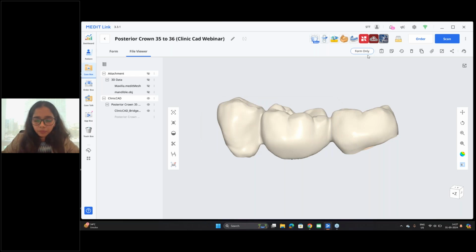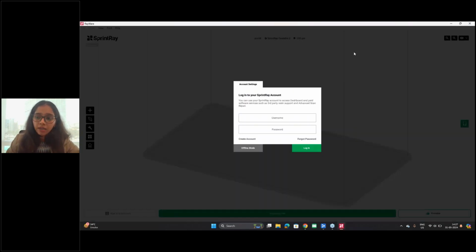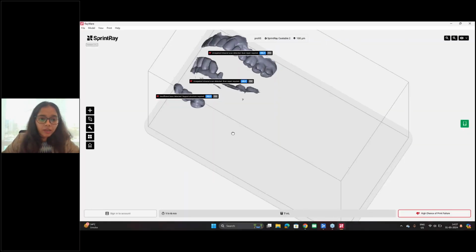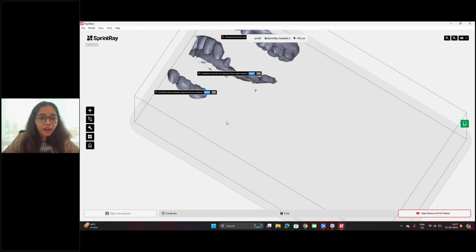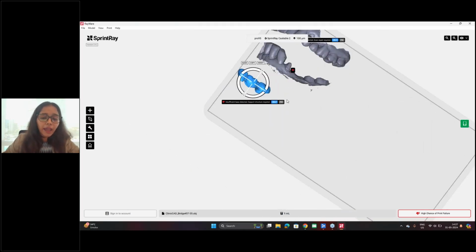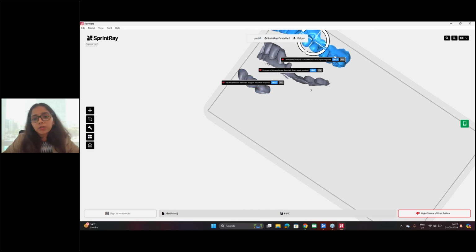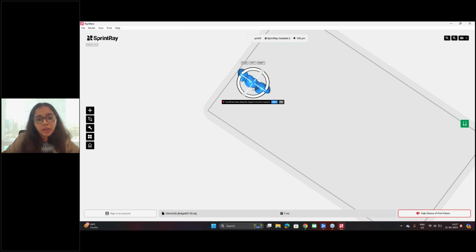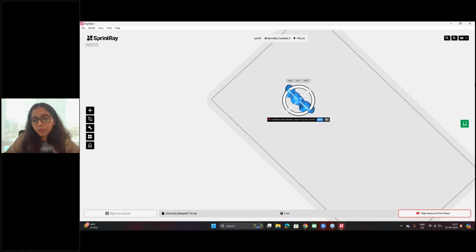Okay. Once I click on it, it will go into the Rayware application. Here. Now, do you see my crown over here that I have got? Now I can nest it accordingly and just send it to my printer. So this is the advantage of using Medit integration apps.